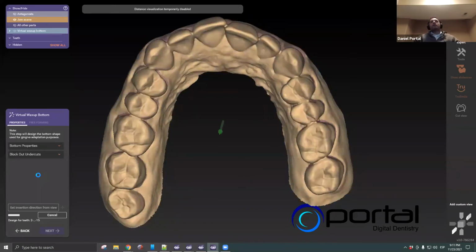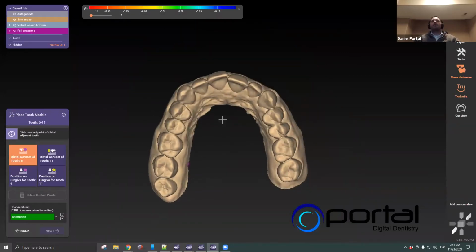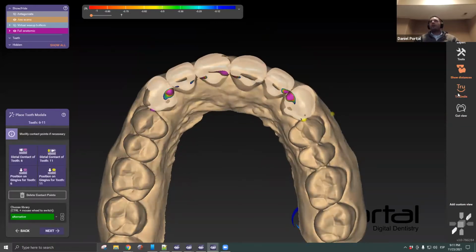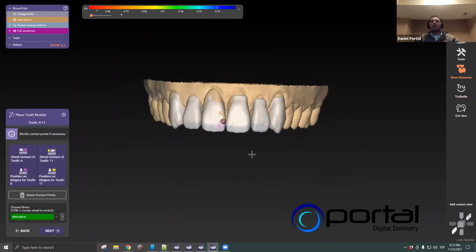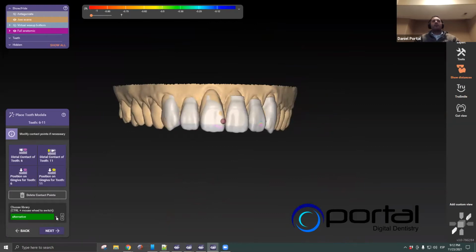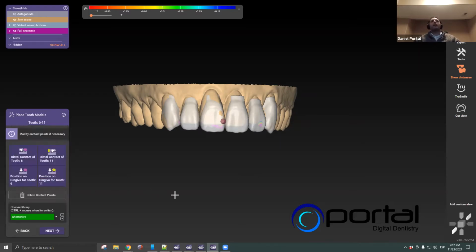And to me, the most useful ones come at this step when you're doing the crown positioning, or the initial crown positioning. And so we will quickly set up an arch here, just to get an idea of what our restorations could look like. We have access to different libraries that we can choose from here. And I believe there's five or six new libraries that were included as part of the basic exocad offering. So as you can see, all these come for free with the software. So there's quite a few of them.